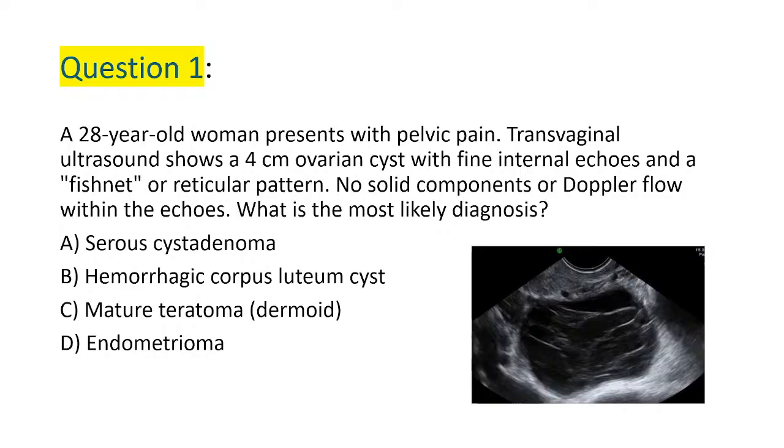As you know, ultrasound is a pattern recognition profession. You have to recognize how different pathologies present sonographically. So it's pattern recognition. For your brain to understand these different pathologies, you need to see them time and again in their various manifestations. That's why we are building up this quiz, so that you can see the pathologies over and over again. Okay, so let's start.